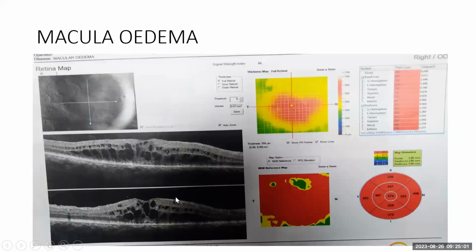Okay. Now, this is macular edema. The cause could be anything. It could be diabetic, it could be post-traumatic, it could be post-cataract surgery, it could be anything. So the history is what makes the difference. Macular edema secondary to complicated cataract surgery, or diabetic macular edema, that one has a definite name, or macular edema in a non-sickle cell retinopathy patient. So you take that down.